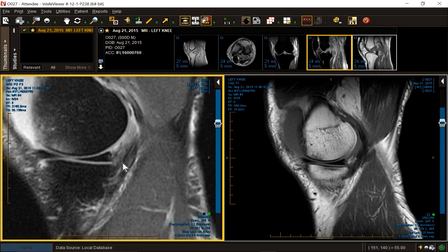And then later on, I'll show you in some greater detail some of the other aspects of the posteromedial corner, including the distal bundle of the posteromedial corner. This one is known as the pars reflexa, or anterior portion of the posteromedial corner, all part of the semimembranosus mechanism. But there is another abnormality here that's part of the posteromedial corner, and that is this. That's the meniscocapsular attachment, and that is injured.